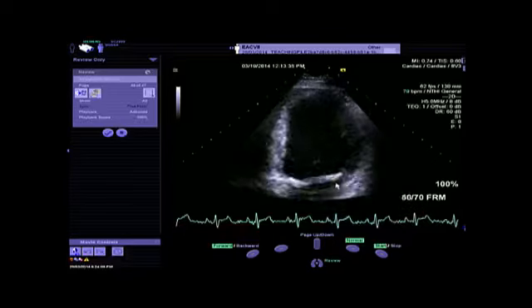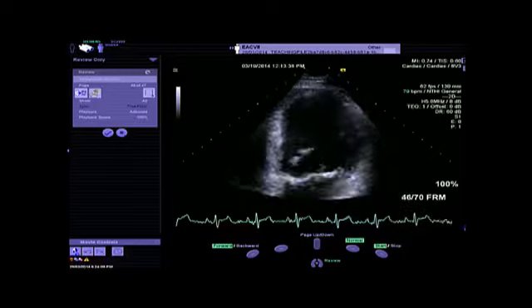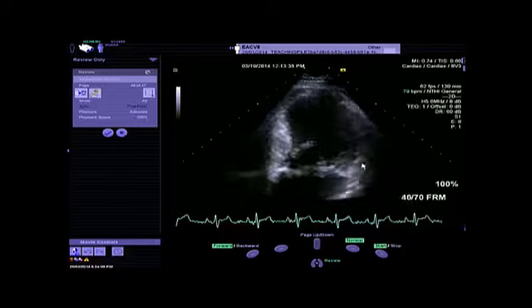And finally, the redundancy, and we have seen that we have redundant tissue, but also the calcification and the extent of calcification. We have some extensive calcification of the posterior mitral annulus also extending to the lateral wall, which will be associated with a high risk of failure of mitral valve repair in these patients. So the likelihood of repair is very low.